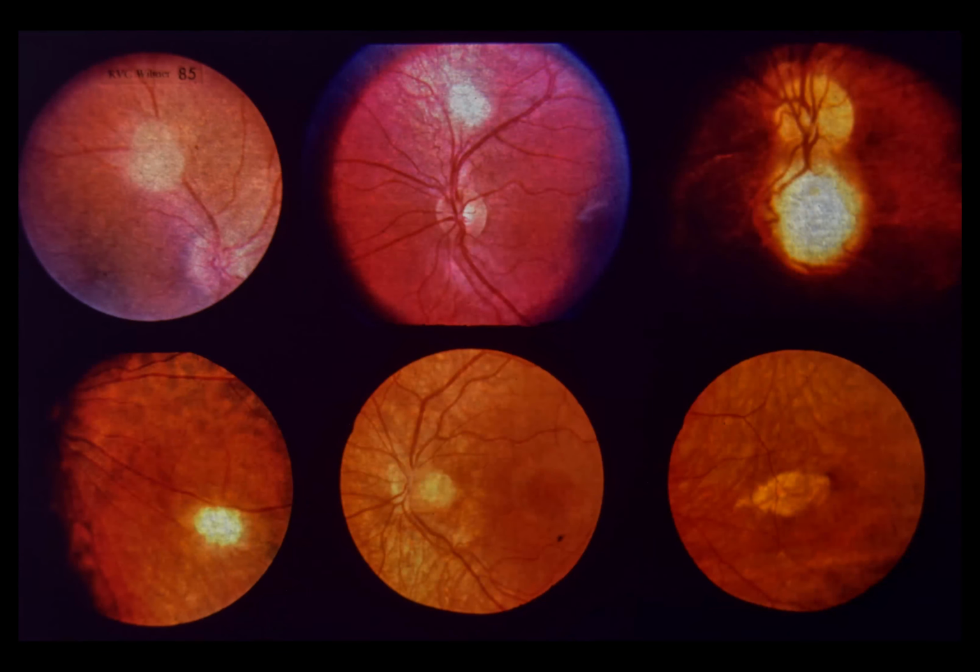Slide 85, tuberous sclerosis. The retinal lesions observed in tuberous sclerosis are varied. Upper left. The classical lesions are retinal hamartomas, generally seen in the periphery as oval or circular, white or gray, elevated lesions that obscure the retinal vessels. Upper center and upper right. The lesions appear to change with time, losing their gray-white appearance and becoming more yellow and glistening, presumably the result of increasing calcification.